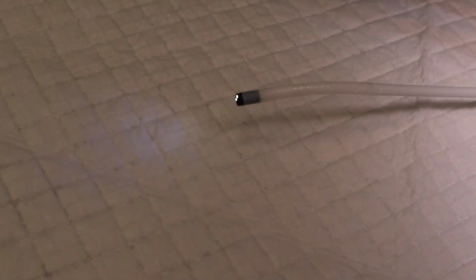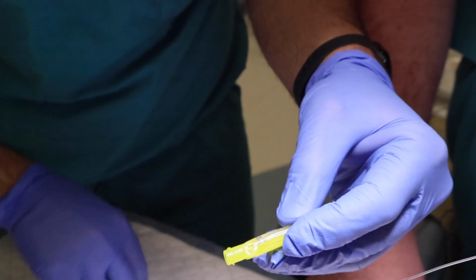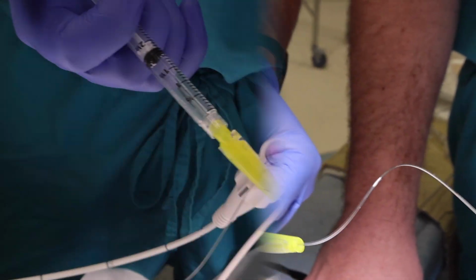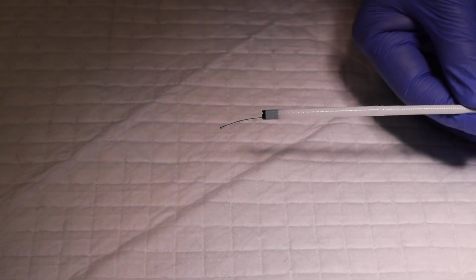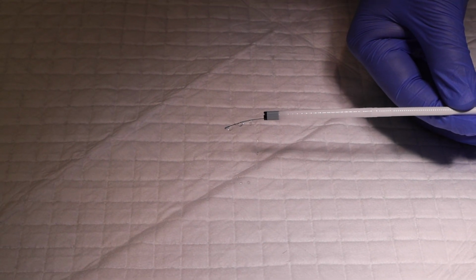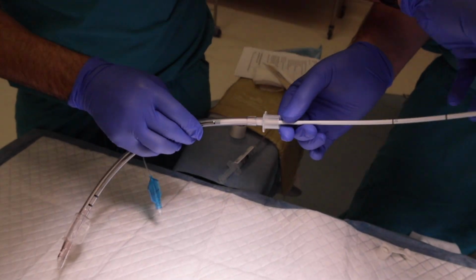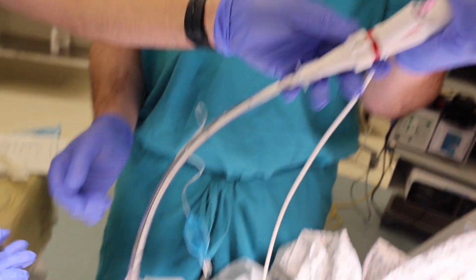After threading the catheter, attach an alligator clip to the end closer to the suction channel opening. Then attach a 3 ml syringe with lidocaine to the clip. When testing the catheter, you should see droplets coming out of the distal tip. Then preload your 7.0 endotracheal tube onto the scope; if available, use a Parker endotracheal tube. Having everything ready and organized dramatically improves efficiency and success.